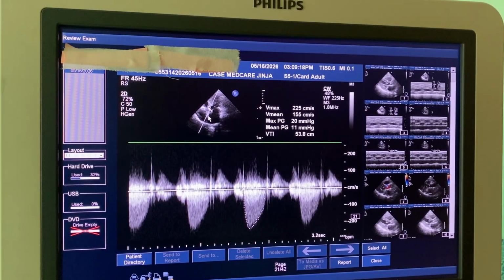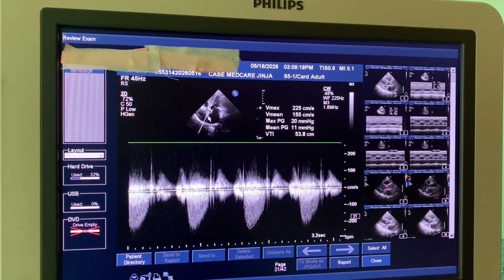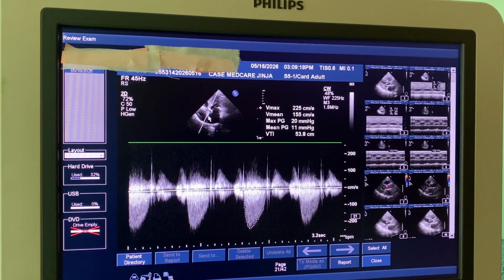Now we go to mathematics. We do physics, we go to math. It's the mean. So DVI is giving us 0.41, which is moderate. Valve area gave us 0.99, which is severe, but it's almost 1. Less than 1, it is severe. So it is also tending to moderate. What lied more? It is the maximum PG and maximum velocity.